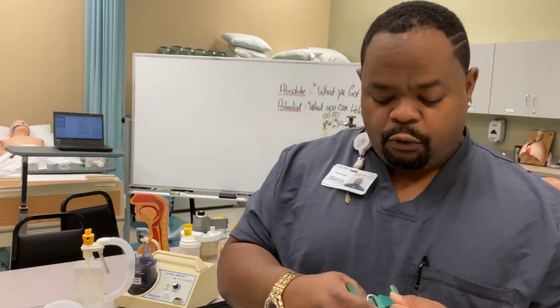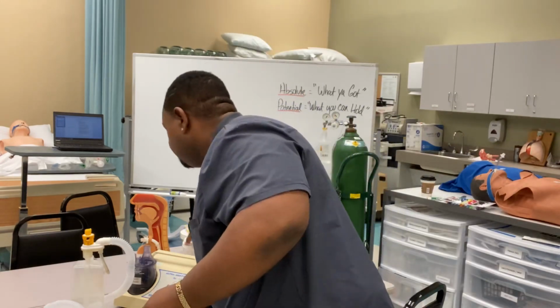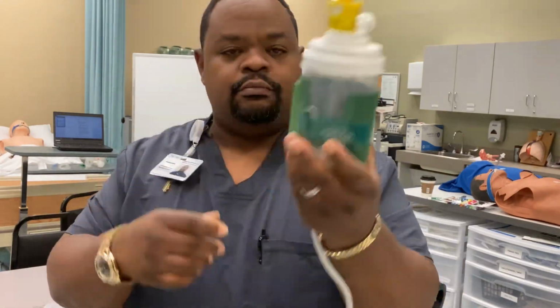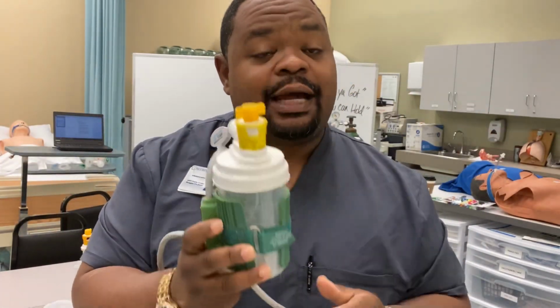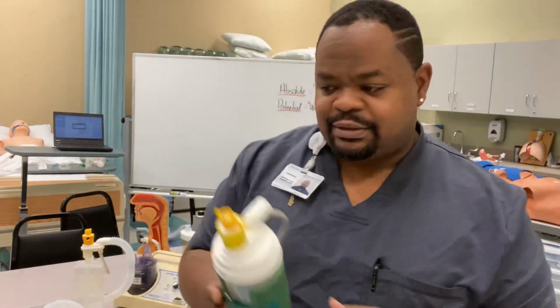So this is a device that simply would fit over one of your aerosol devices, right? This will slide in here like this. See that? This will plug up to the actual power, and this gets hot. This makes the water inside of here moist and hot, right? Now, as the gas comes out, it's heated and humidified, okay? So this is a type of heater for humidity, okay?